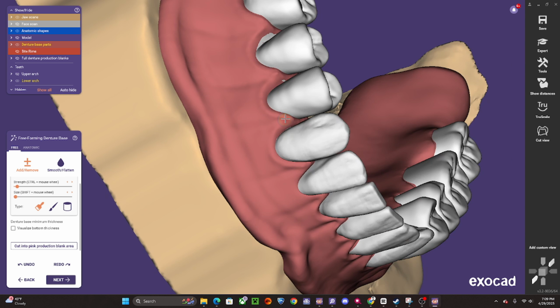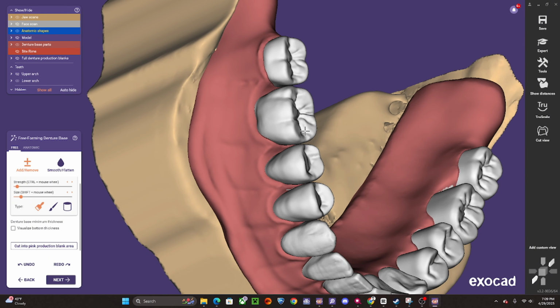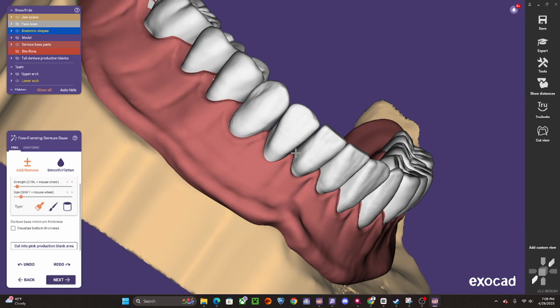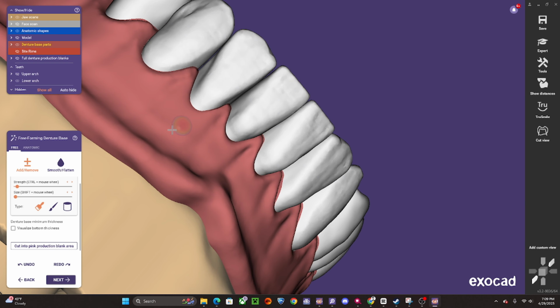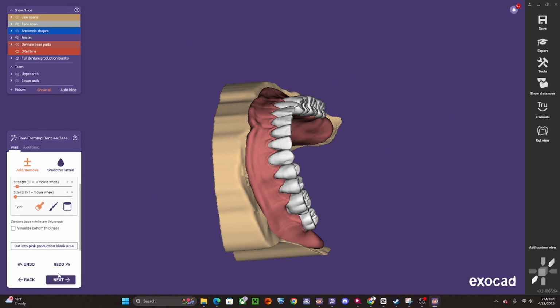And that's huge to how everything post-processes. I found huge success with cases coming out like this, and we get really good photos right out of the mill with it. All right, I'm liking it.